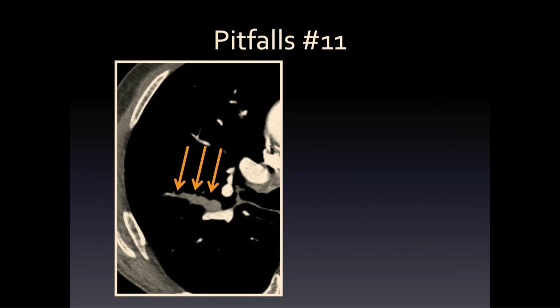All right, next pitfall. Low density next to a vessel. You wonder if that's a cutoff sign, a branch of the vessel. But there are a couple of things weird about it, right? One, it is unusual to have an abrupt cutoff at such an acute angle, leaving the regular vessel next to it perfectly fine. And look how it has that lumpy, bumpy appearance.